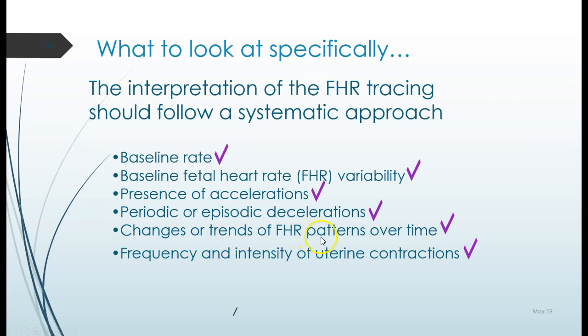Then look at the change over time. Hopefully if it was 120 over here and now you're looking and it's 135, you can tell that's a change over time. And then the frequency and intensity of contractions.